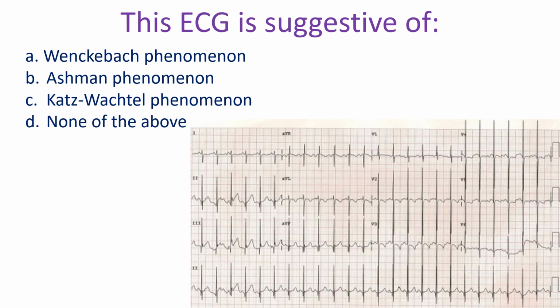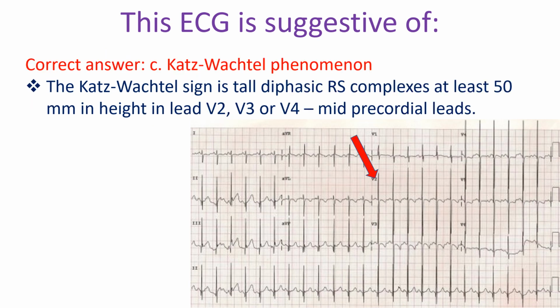This ECG is suggestive of A. Wenckebach phenomenon, B. Ashman phenomenon, C. Katz-Wachtel phenomenon, D. None of the above. Correct answer C. Katz-Wachtel phenomenon.